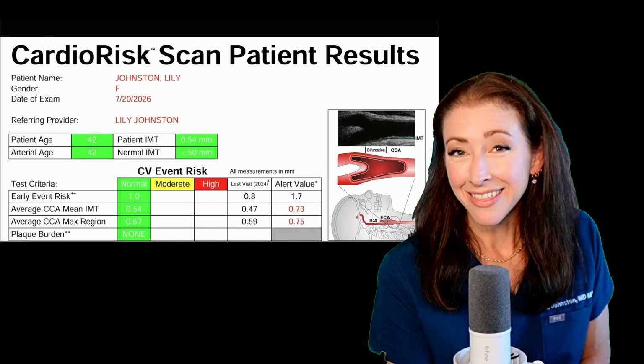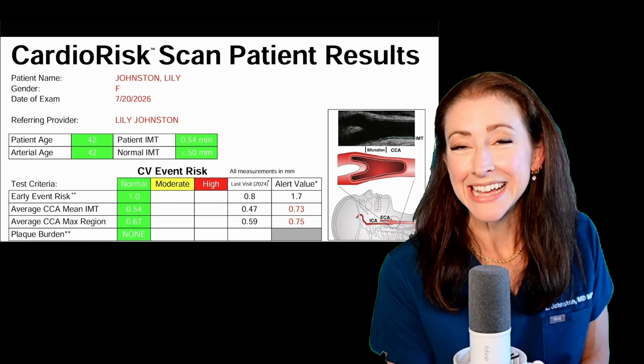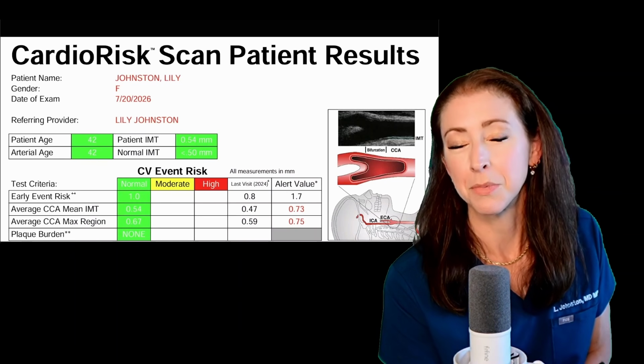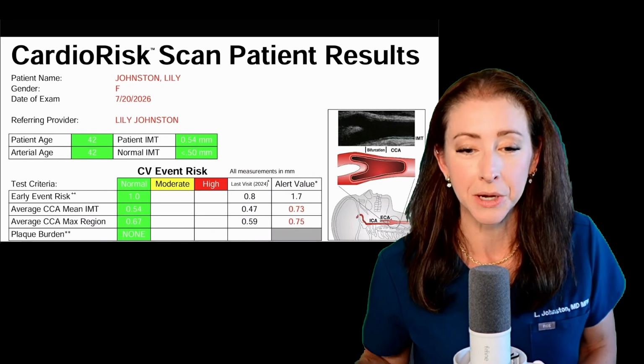Like, my health is the best it's been in 2 years, and yet I still have some progression of my IMT, more than I'm comfortable with. But let me go through those numbers and show that to you here.